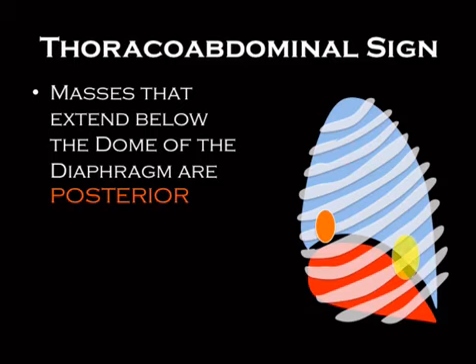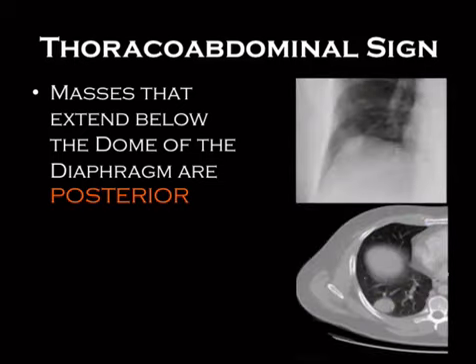But as we go further back, a pulmonary mass that's still in the lung would look like it's underneath the diaphragm, being more posterior. Bottom line, the posterior costophrenic sulcus extends more caudally than the anterior basilar lung. So there you go.